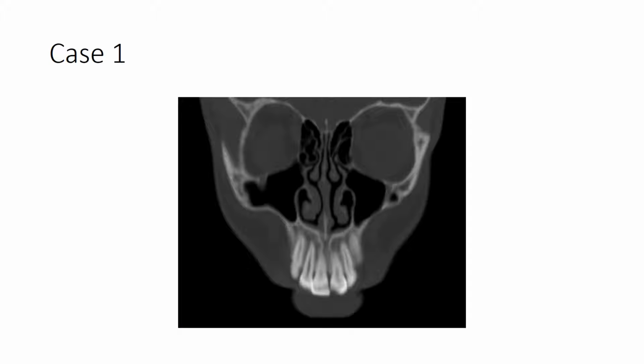Case 1, this patient presented after trauma to the midface, and you can see that there's a relatively linear loss of tooth structure involving the left maxillary central incisor. There's loss of the enamel, and probably a little bit of loss of the dentin as well. There's no decay on this tooth, no demineralization, and no obvious periapical radiolucency. So in the setting of trauma, this appearance most likely represents a type 2 dental fracture, because it involves the enamel and the dentin, of the left maxillary central incisor.